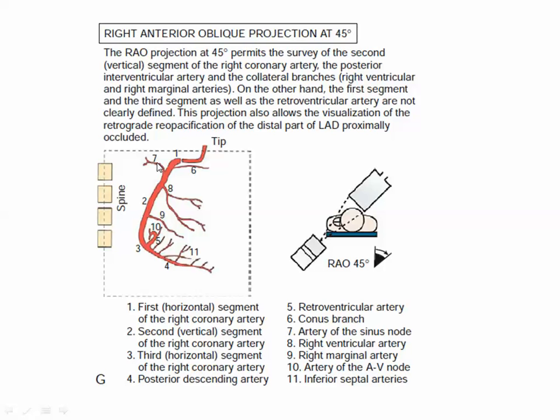What's this? SA, yes. Why? Because it's the atrioventricular plane here, and here is the RA and LA, and here is the RV and LV, anterior, apex and inferior. Yes. Okay, Marwan. Anterior, apex, inferior, it's the ventricles, LV and RV, while behind are the LA and RA. So this is the marginal, this marginal, this PDA. PDA with perforators, Y-shaped.